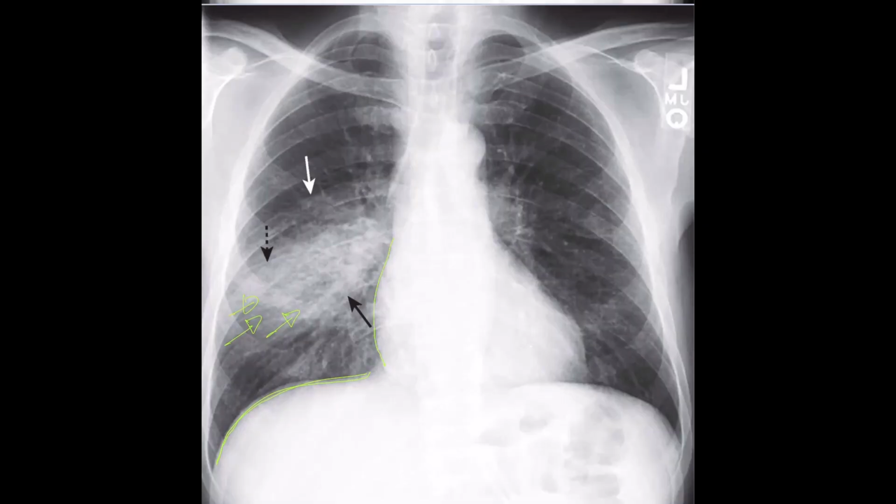So I just wanted to touch base about the air bronchogram that I mentioned in the airspace disease here. Bronchi are normally not visible because their walls are thin and they contain air inside, and they are always surrounded by air in normal lung. But when something like fluid or soft tissue edema replaces the air that is normally surrounding the bronchi, then the air inside the bronchus becomes visible as a series of black branching tubular structures, and this is called the air bronchogram. So the air bronchogram is actually the air inside the bronchi, but now it is visible because it is surrounded by fluid.